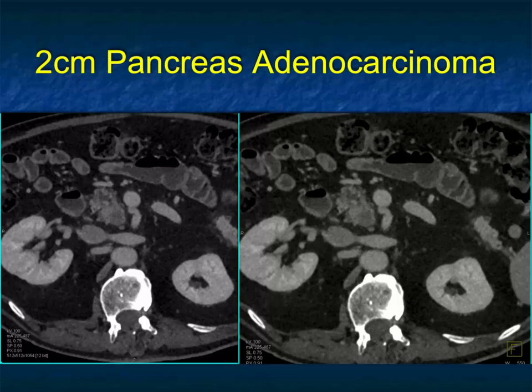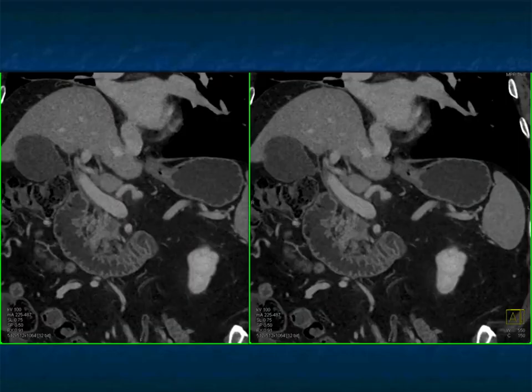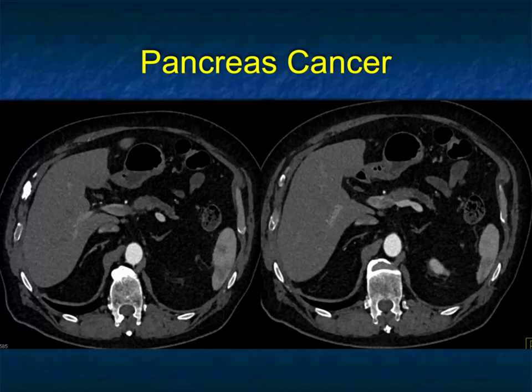We'll do this quickly just to go through them, of where the case is an example of a tumor that was missed initially. Here's an example. There's a subtle mass, textural change in the head of the pancreas. Not very tricky. It's under 2 centimeters. When you look carefully, it's a dilated pancreatic duct. There's atrophy of the gland. The patient had a dilated duct previously, which was not commented on. Now the tumor is more obvious. Now there's no vascular invasion. This patient will get chemotherapy and hopefully be resectable in a few months. But there's the tumor, under 2 cm near the uncinate. You've got to pick that up.